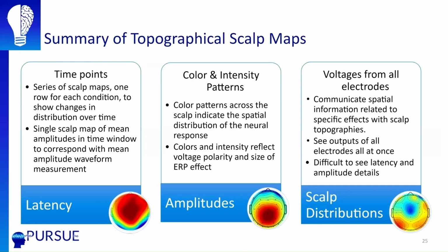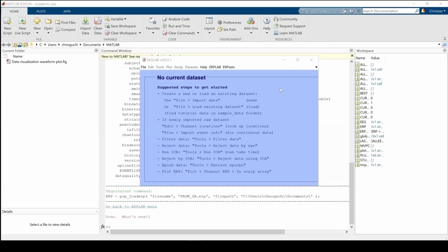Here are the take-home points for scalp maps. I will now be getting into the tutorial. I will be starting off with how to make waveform plots first.